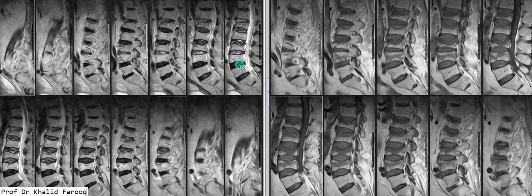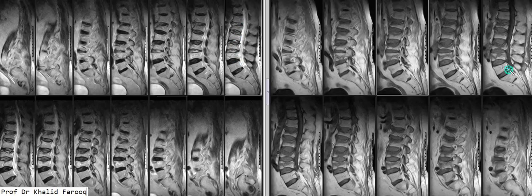Similarly, we see that all discs are preserved and there is no abnormal pathological tissue in these discs. So this rules out an infective component in the spine as well. We can see the posterior osseous elements, that is the spinous processes, on sagittal T1 and T2 weighted sequences, which are normal. Similarly, the sacrum shows normal marrow signals, so the possibility of metastatic disease is also ruled out. So in this case, we have ruled out metastatic disease.